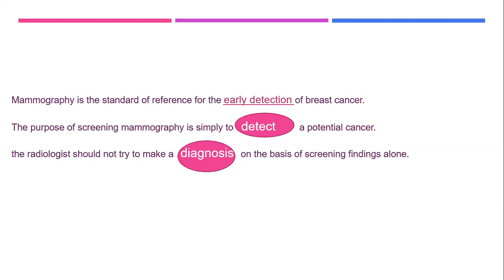Sarah. Yes, Dr. Rabba. Why did I highlight them? Okay. Usually in screening mammogram, this is our aim: there is abnormality or no abnormality. Is it negative screening or positive screening, or is there a positive abnormality? Okay. So after that, if there is any abnormality, we will give it BI-RADS 0. Then after that, to do a diagnostic mammogram, we have to diagnose. Yes.